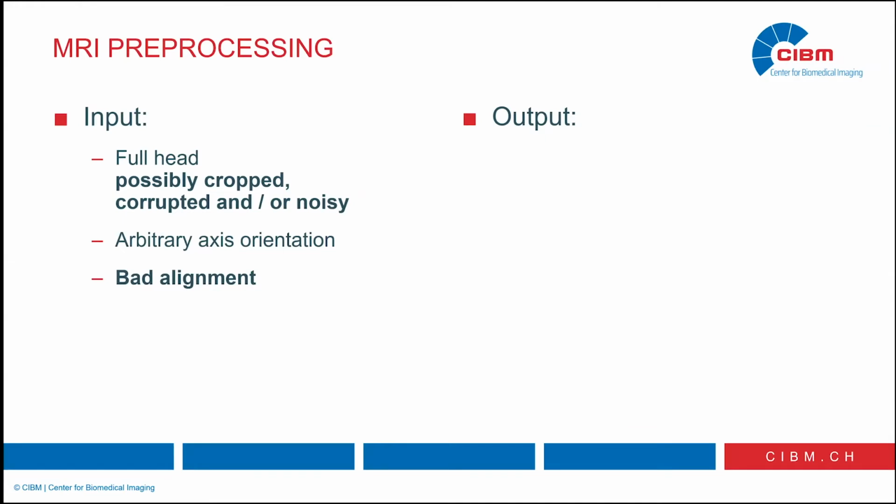When I'm talking about alignment, patients very often have a bandage, or they got an operation somewhere on the skull. So when you position them into the MRI, you get the problem that maybe the head is tilted, and you cannot work around that because that's a patient. And of course, the classical bias field problem, but that's not specific to our case.